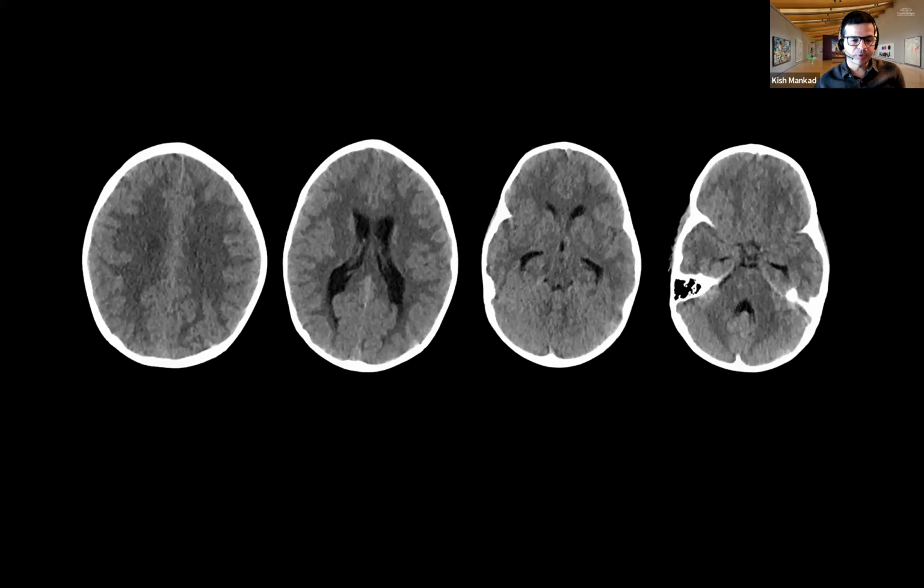You can't prognosticate, you can't even advise whether this is going to cone or not when you do a lumbar puncture. But having said all that, I believe this investigation still happens, and it has its place in the sun. But the question is very important. Here the question is: is it safe to proceed to lumbar puncture? Which means you are deciding whether this is a normal or an abnormal scan.